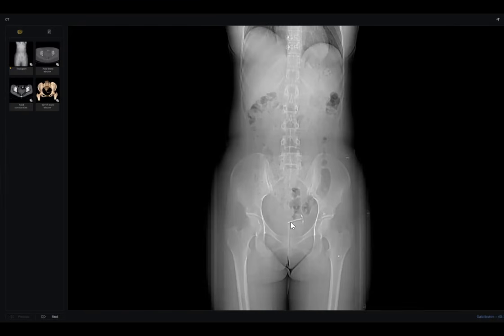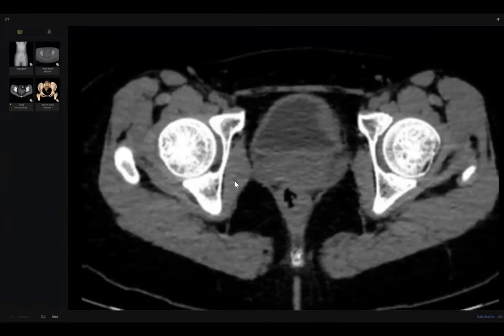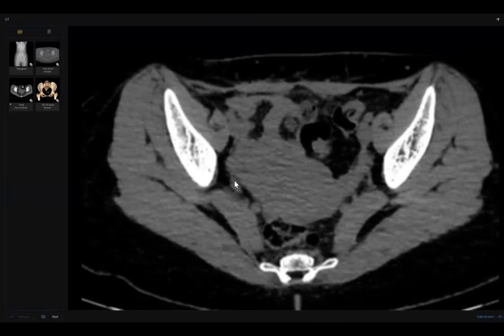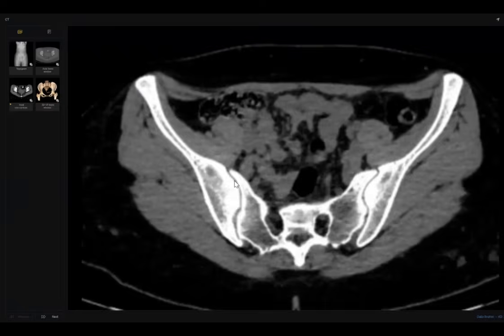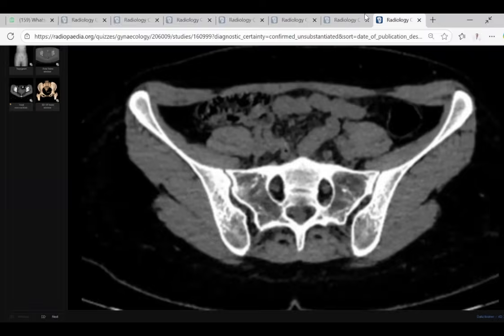See here, very easy, very classic, even from the scout. Migrating IUD outside the uterus. If you look here, this IUD, as you see, didn't cause any intestinal obstruction. And in the MRI and CT, it didn't cause any hemorrhage. And the patient has long-standing pain. So I think this is not urgent, okay? Because it is very important: urgent in the NHS means almost life-saving. Okay? Thank you, doctor, so much.